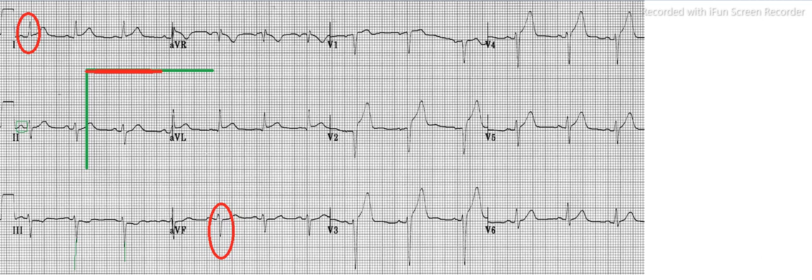So I will draw this going up. Since the negative AVF is okay, the magnitude is more, so somehow like this. Now we draw imaginary perpendicular lines.